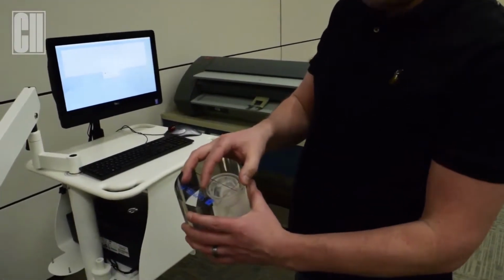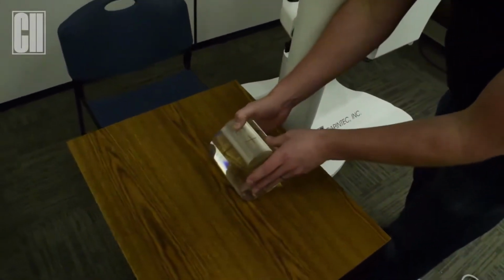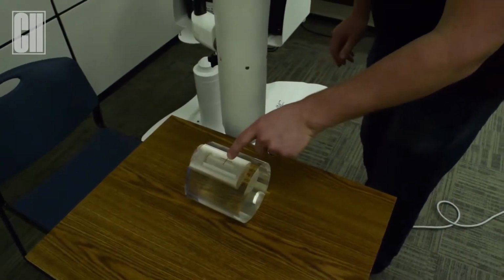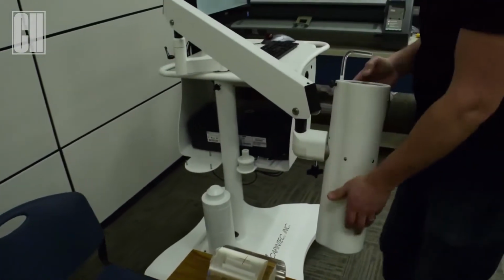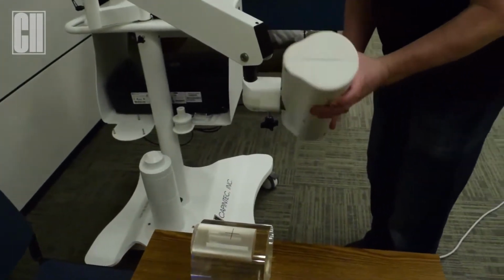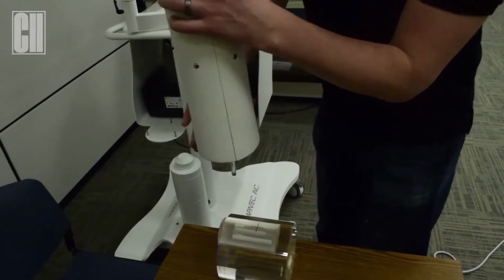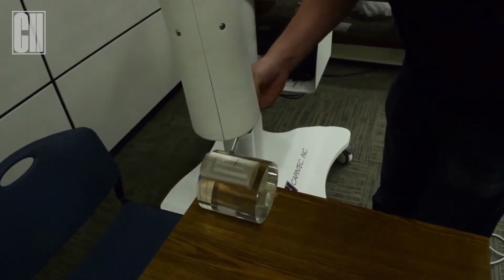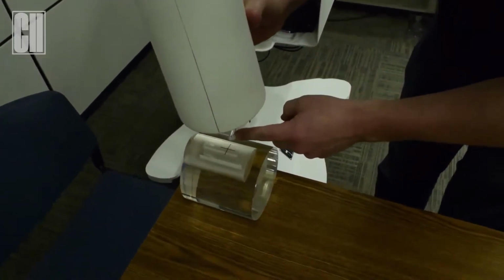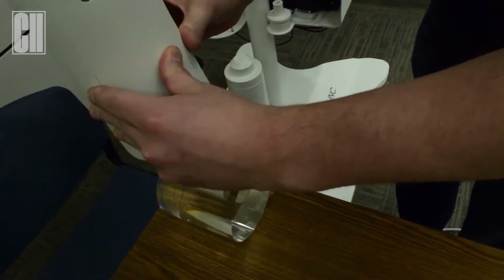So when we have the capsule lined up, in this case, we're going to lay it on the table, down, and aim for our center point. So our goal is to get the line of our pointer rod directly in the center of that cross.